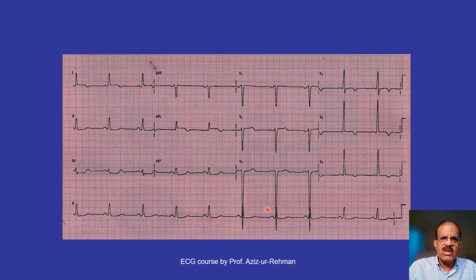So let's take this one. This patient also presented with chest pain. If you see this rhythm, right? This one, we don't see any problem with the rate or rhythm. And now we scan limb leads 1, 2, 3. In even the first limb lead 1, you see some ST segment elevation.